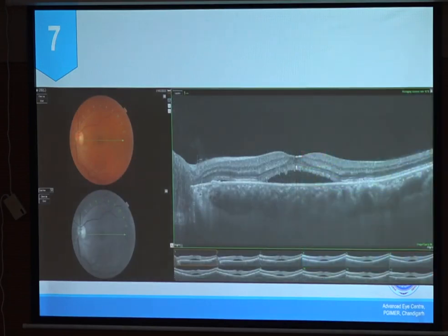This is central serous chorioretinopathy, a subretinal fluid pocket, along with some PEDs and a very thick choroid that you see, the large choroidal vessels kind of compressing on the choriocapillaris, which is part of the pachychoroid spectrum as we talk.